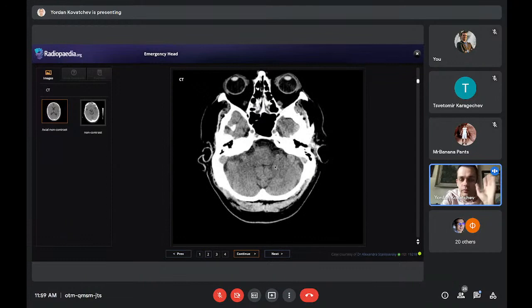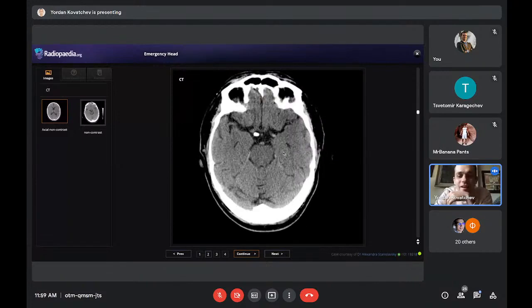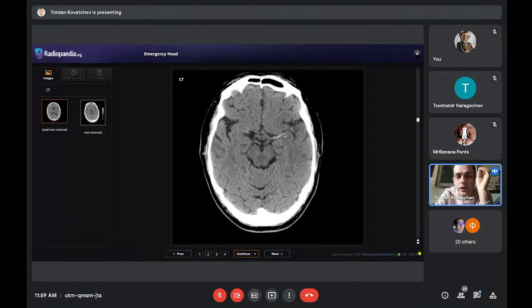These are artifacts. The brain is normal, and then we go up, and as our colleague said, we see what we call hyperdense MCA. So I told you about loss of insular ribbon. Write this down. You sound smart when you say it in front of your friends. And then the second thing I want you to remember is the hyperdense MCA. Remember, I emphasized the MCA. It's really important. The carotid arteries enter the brain and they turn into the middle cerebral arteries.